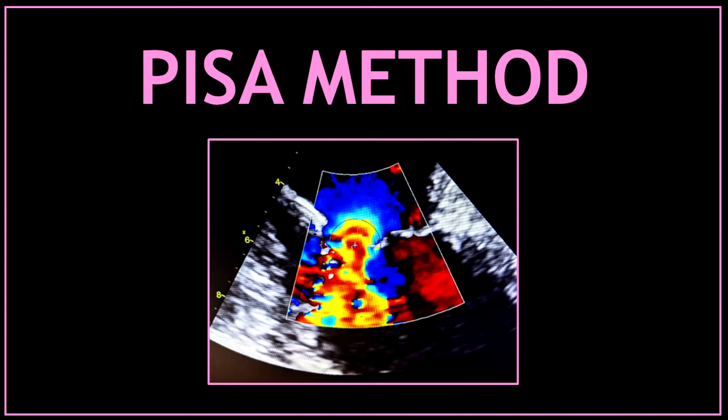In this video I'm going to talk about the PISA method. This is a very simple quantitative measurement for the assessment of valvular regurgitation.